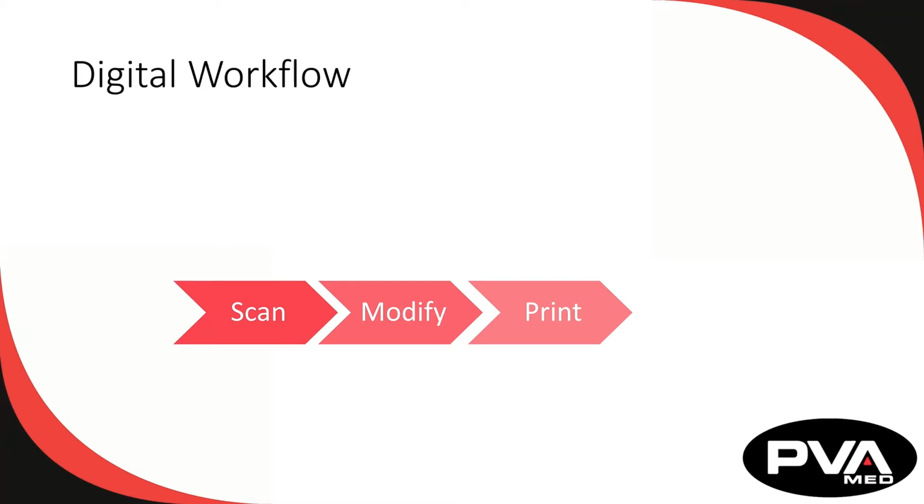When we get to the fit step, the digital and traditional workflows converge. In other words, the tools and techniques used in post-processing of a 3D printed check socket are very similar to those used to prepare a pulled check socket for fitting. This includes how we would remove excess material, grind and polish trim lines, and add a distal attachment.